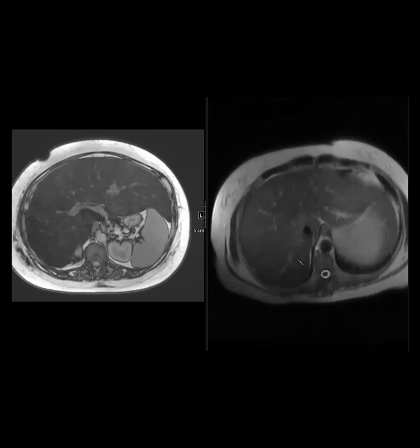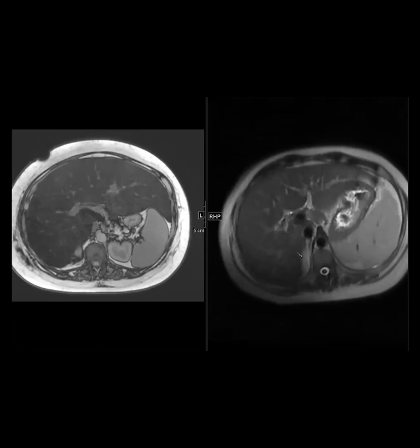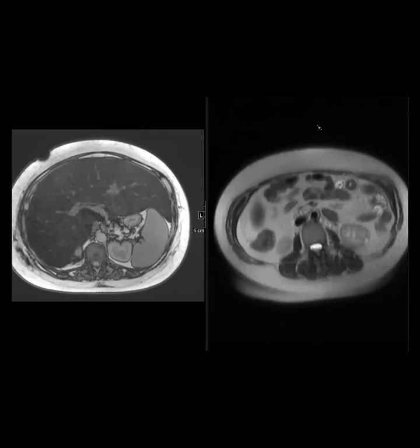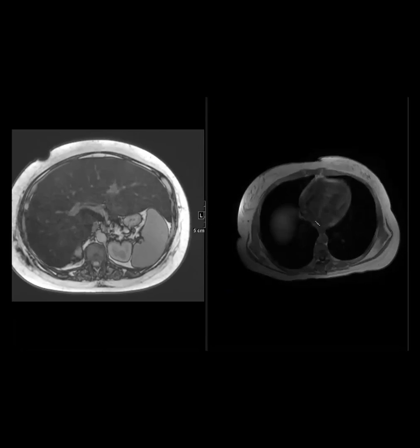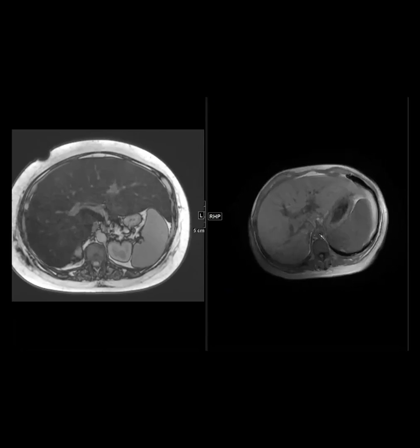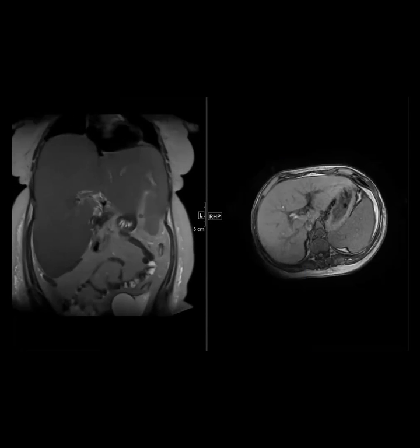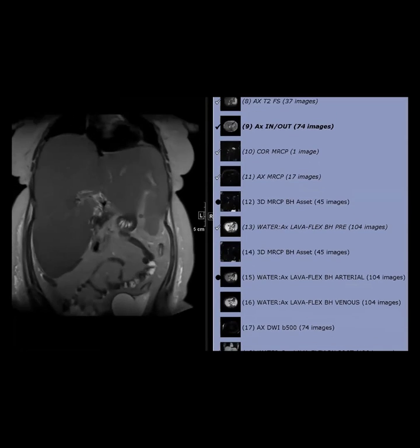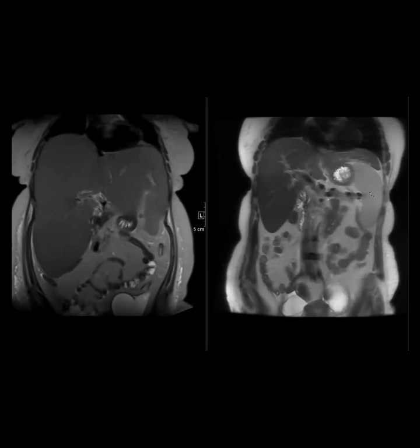And this is 4 months later after exercising and stopping drinking. You can see that their liver has significantly recovered. This is in, out of phase. I didn't realize how quickly you could recover, but it was pretty impressive. We were all amazed and inspired to go out and have healthier behaviors so we can fix our liver.